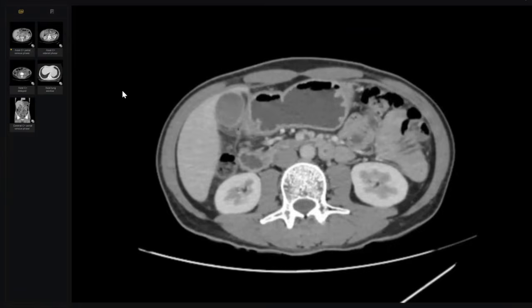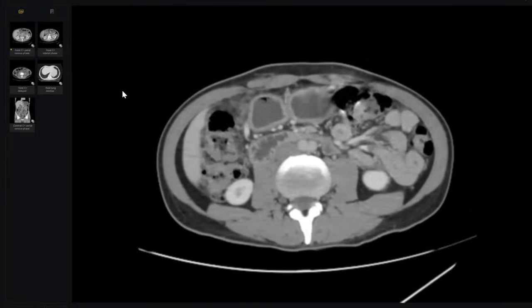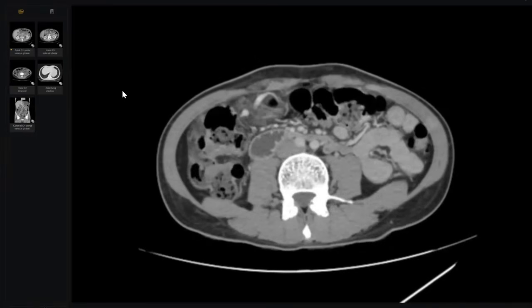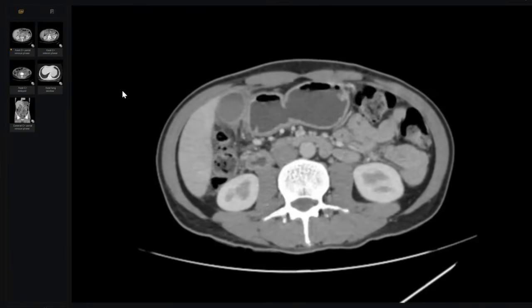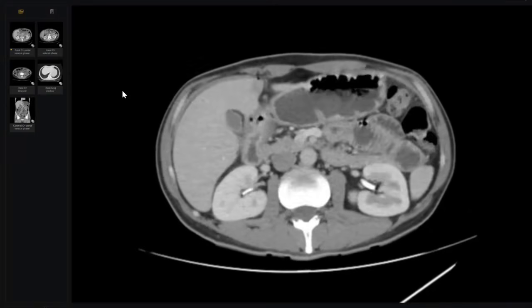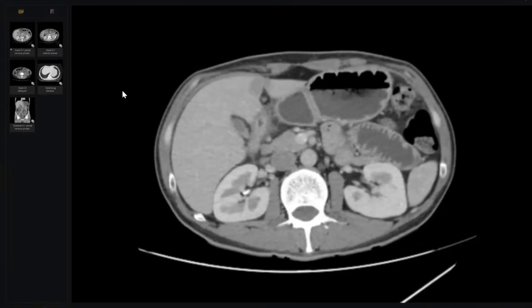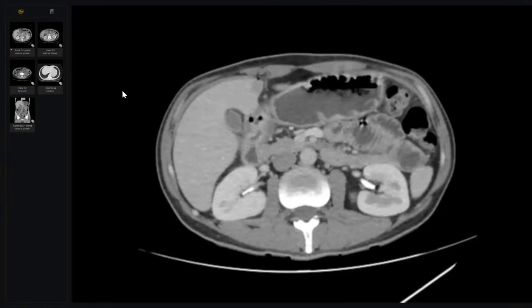Stop at the area, at the slice of interest for you. Okay. Can you go up again? Sorry, can you go down again?